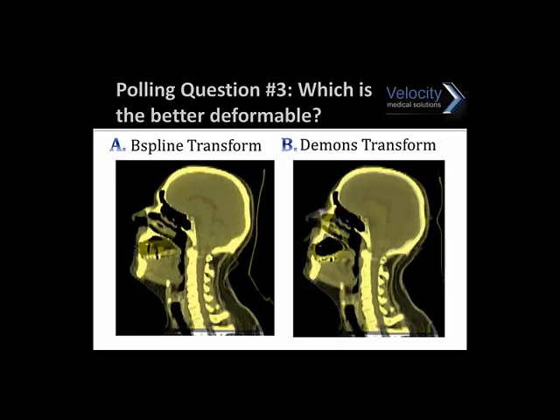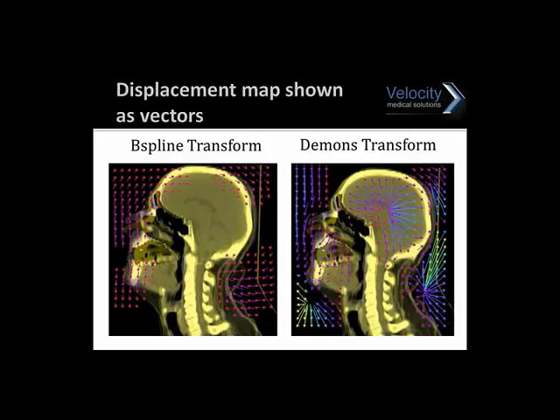So anatomically, we know that that doesn't happen. And maybe what's concerning is the area in the back of the oral cavity, like the back of the throat, that there are voxels moving down there, even though it was not that far from the rigid starting place. So let's quickly go back to our original picture to examine what could be the cause of this.